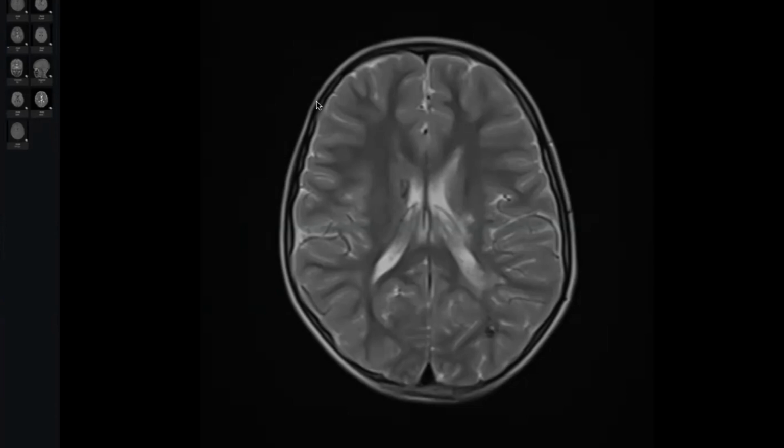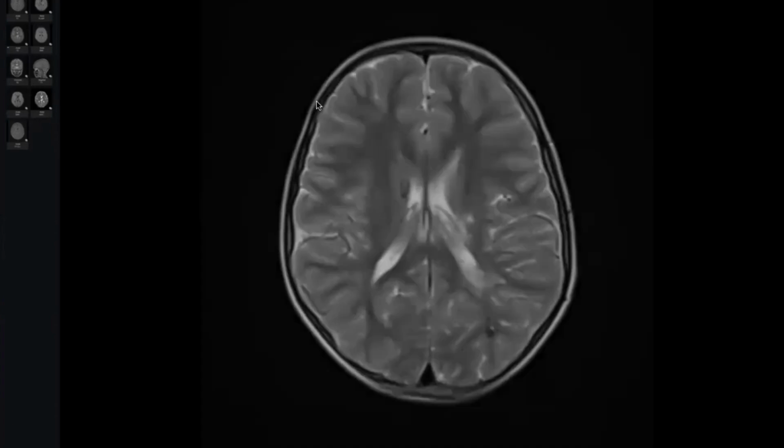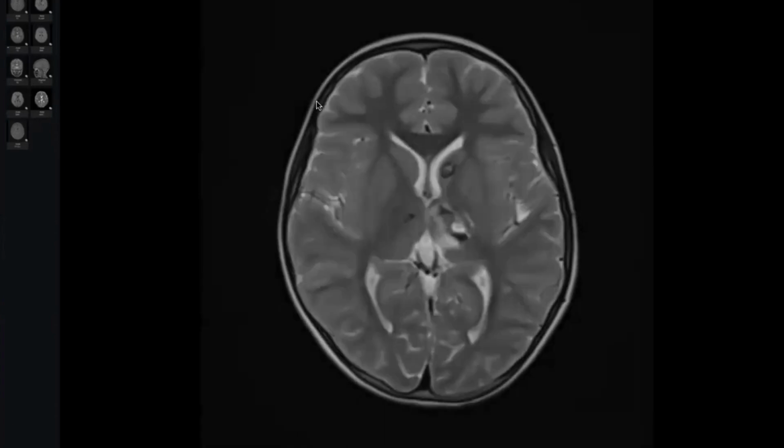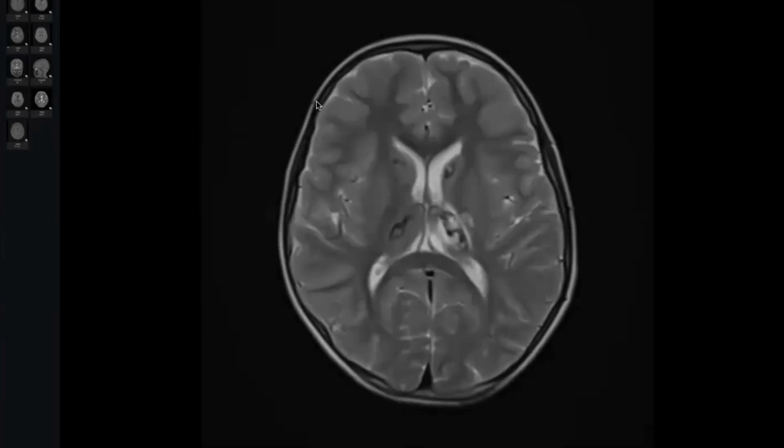Infarct. What else? Infection. What else? Or systemic disease, depositional disease. Okay, I will help you.